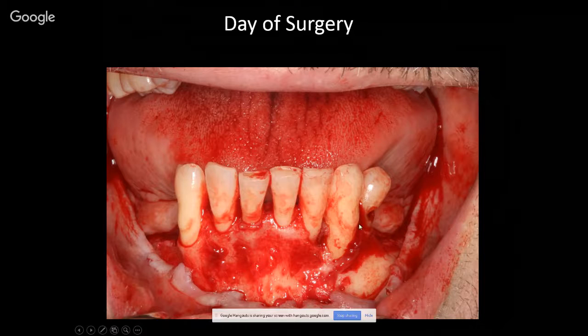And you can start to better appreciate the deficiency in the posterior mandible in both of these areas, with very poor quality of bone. Had this canine been a little bit better in the periodontal condition of all these teeth, the long-term prognosis would have been a lot better. Obviously we've done some things to try to keep these teeth, but it was obvious, and after discussing with the patient, that we were to remove all these teeth.